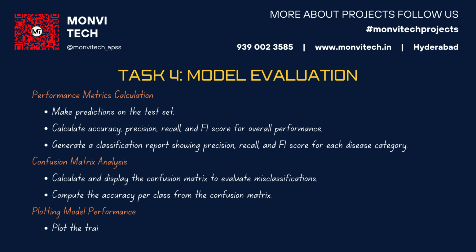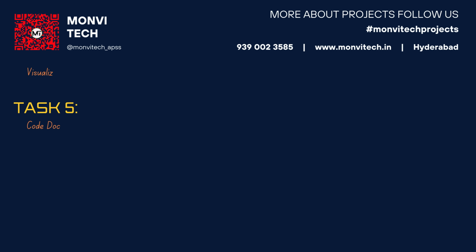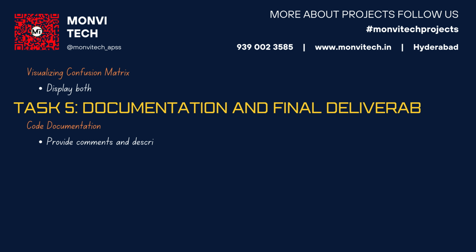Plotting model performance. 1. Plot the training and validation accuracy and loss for each epoch to assess model learning patterns. Visualizing confusion matrix. 1. Display both a raw and normalized confusion matrix for easy interpretation of model performance per class.